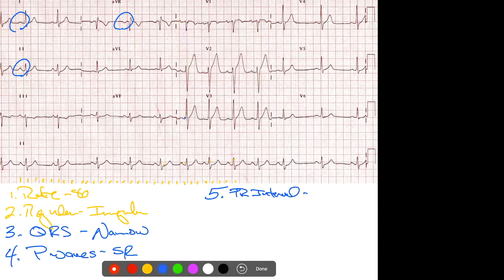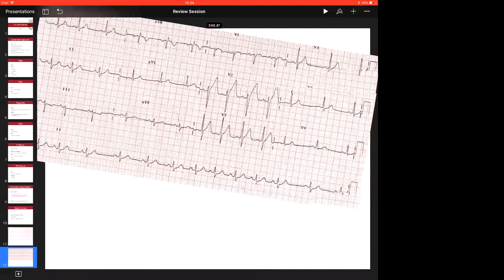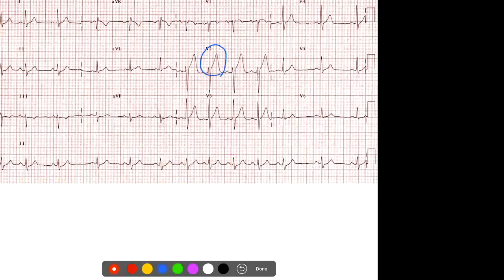It starts here and ends here, and I'm counting 2 small blocks in the middle. It looks like a smiley face, which would be 0.08. I was looking at that humongous hump in the middle. I think you're looking at the T wave. Are you talking about these right here? Yeah, sorry, ignore me. Yep, those are the T waves.